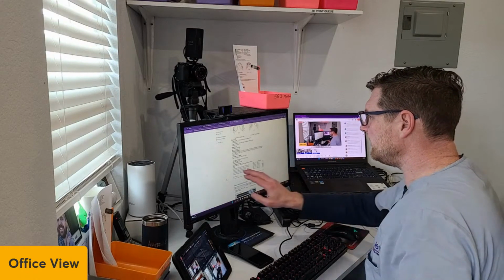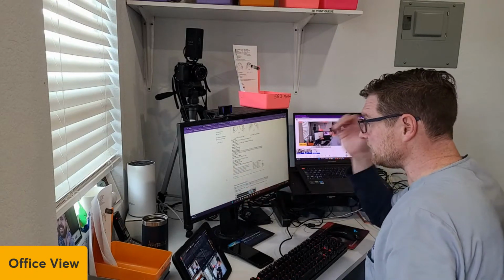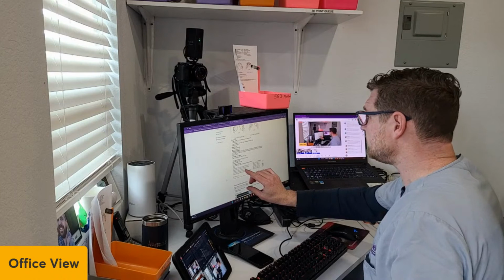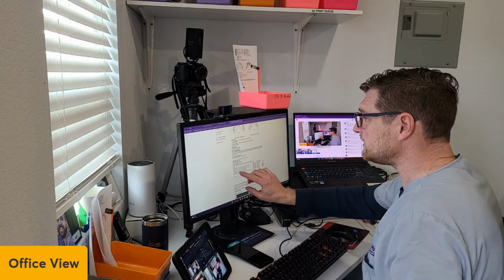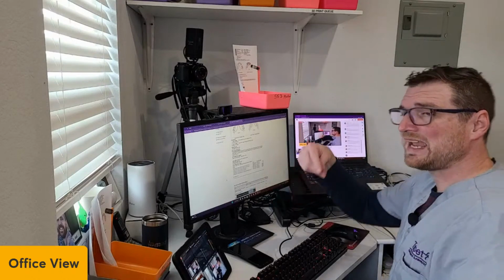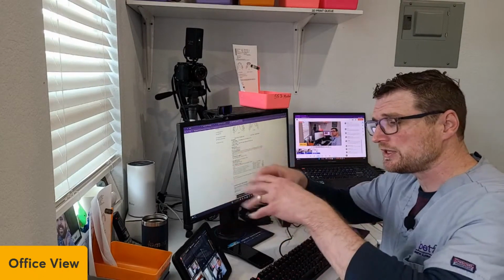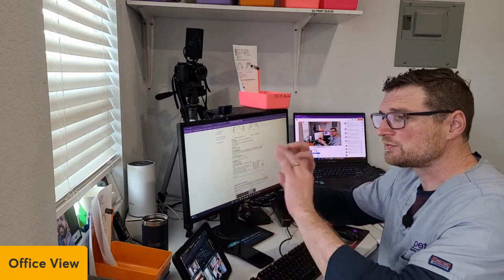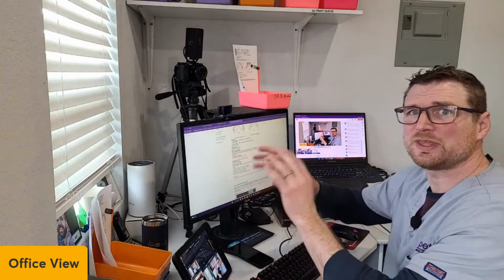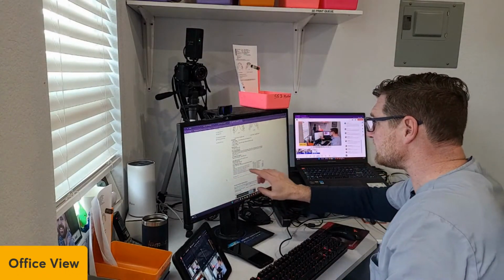If you can see in here better, the patient's name is in here, so I can't show you very well, but this shorter one here says original, and so that's the lower scan original, upper scan original. Once a scan is attached to EasyRx, EasyRx optimizes it. So it goes in there, cleans it up, smooths it out where it's rough, patches any holes, and so then it's called optimization. So it actually optimizes it, and those are those two ones on the top.